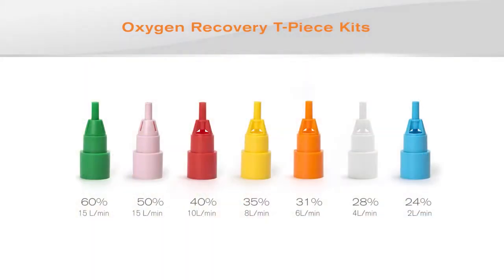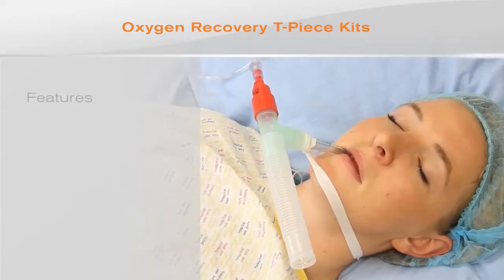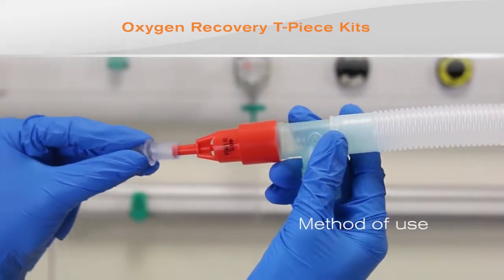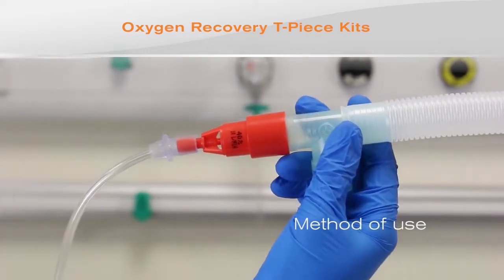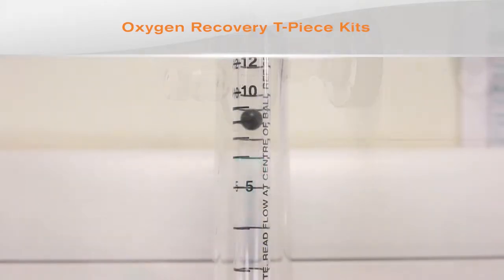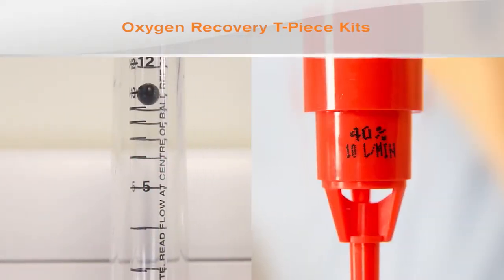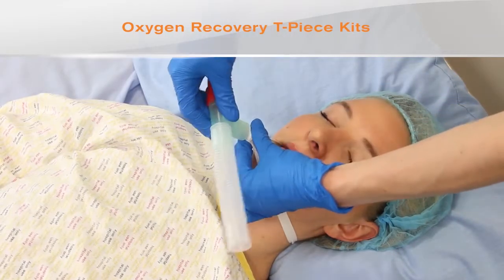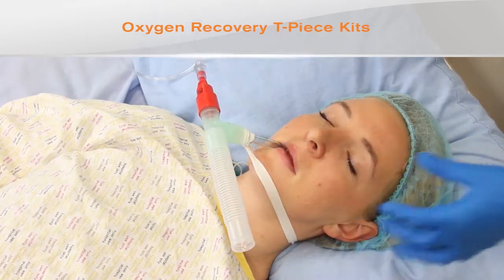The most popular is the 40% valve. These are used to provide spontaneously breathing intubated patients with supplementary oxygen during transport and in the recovery room. Attach one end of the oxygen tubing to the valve spigot and the other end to the oxygen flow meter, and set the flow meter to the flow indicated on the valve. Connect the T-piece to the 15mm connector of the tracheal tube or supraglottic airway device.